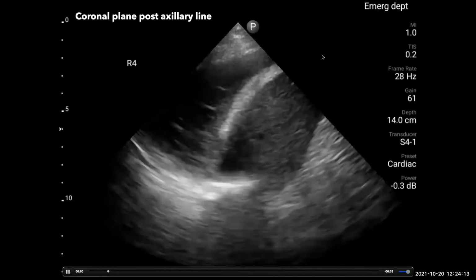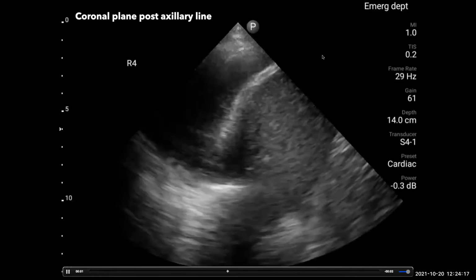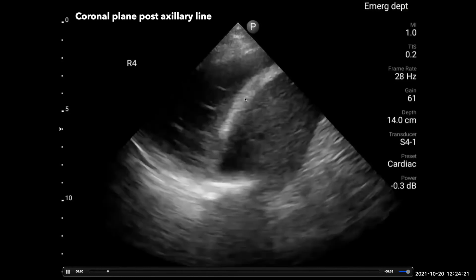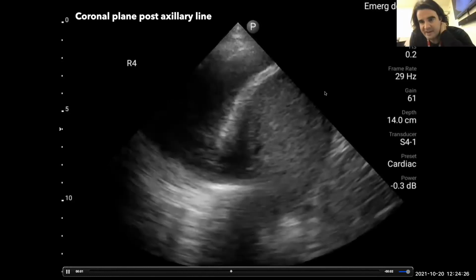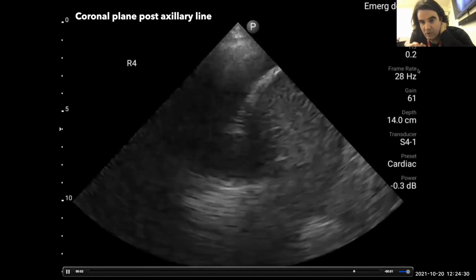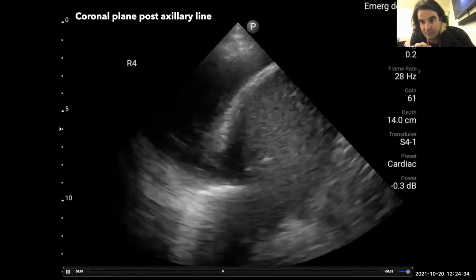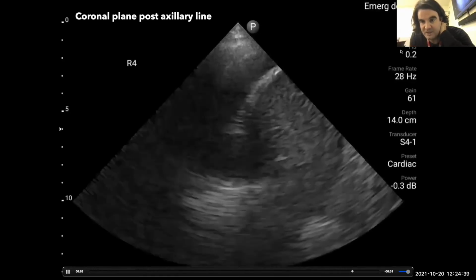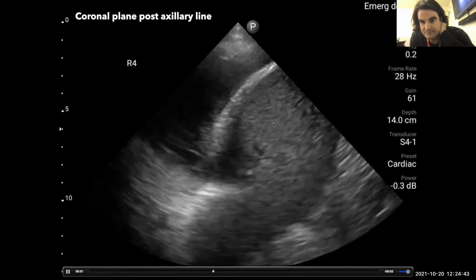Empyema, Brian, is this a loculated empyema with consolidated lung? Were there B lines in that very first image you showed, where that anterior pleural effusion was? Was there lung with B lines underneath that? It's hard to say if they're truly B lines. Certainly the lung is compressed, and that hyperechoic line is probably in fact an air bronchogram. It's probably just air that's trapped in the lung itself and can't escape, generating this very strong signal, which can look like a B line.